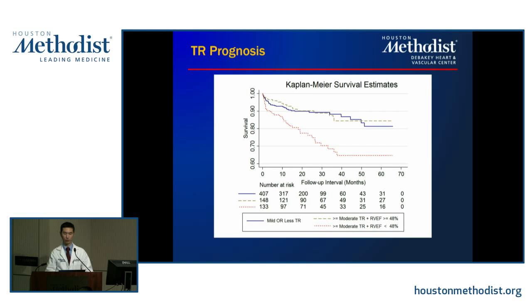Here's a very nice example of a patient who had confirmed pulmonary hypertension. One thing I also included here was enlarged PA. Keep in mind that this is sensitive for pulmonary hypertension, but not specific. You can actually have PA dilatation for any number of reasons: high flow state, aneurysmal PA as well. So it's not specific to PH.